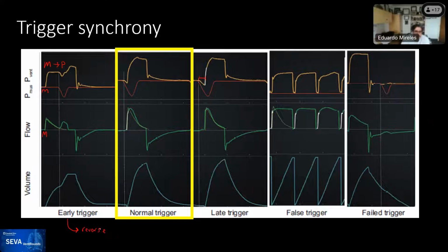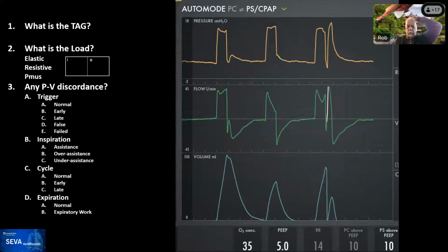And so let's move on to the case. You got a glimpse as I was moving through this slide. I want you to take a look for a couple of seconds, and we are disclosing the full slide here of a patient, just so that you have an idea. This patient was on pressure control, and then we activated the auto mode. This is the transition from pressure control to auto mode on this patient. And this had a good transition, so we decided to put that here for you to be able to see it.